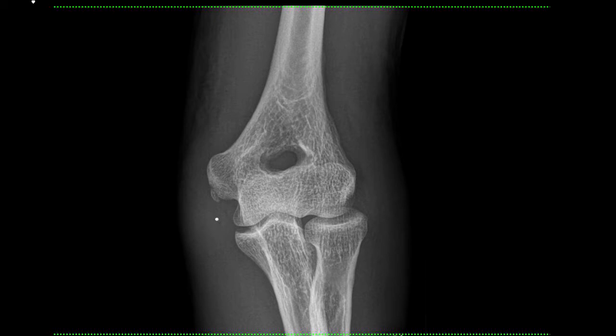But that's just to see a quick normal anatomy, because you're going to see this sometimes, and don't be afraid, don't attack it right away as a fracture. Unless the patient, of course, has amazing pain there, then okay, it's probably a fracture, but keep also in mind that it could also be a normal finding, like in this patient.